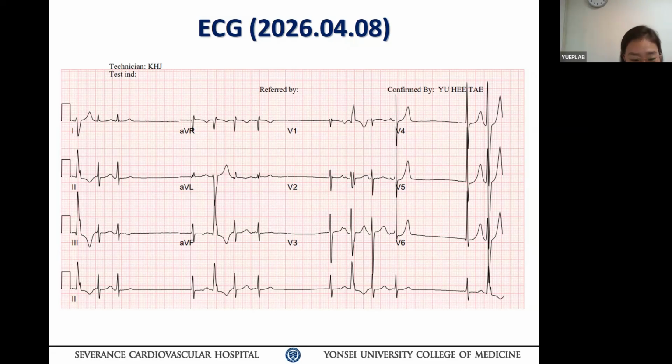Caliper and stethoscope are the basic weapons for a physician. Regular or irregular? Regular, almost all. Are you sure? We don't like the terminology, but almost regular.